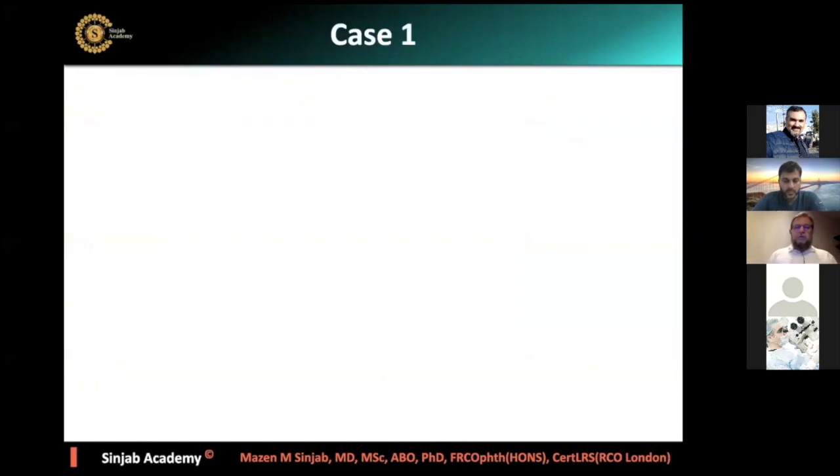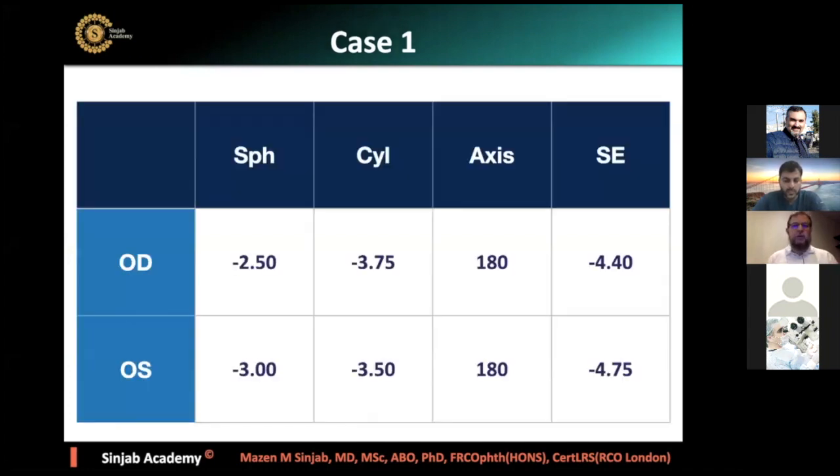Now, after this introduction, I'm going to show you 11 different cases, to show you how we have to pay attention to every detail on the corneal tomography. Of course, we have to take into consideration the spherical equivalent if we want to read the Pentacam, because in the Pentacam, usually we use the table of Bell and Ambrosio for the elevation map, as I mentioned before.